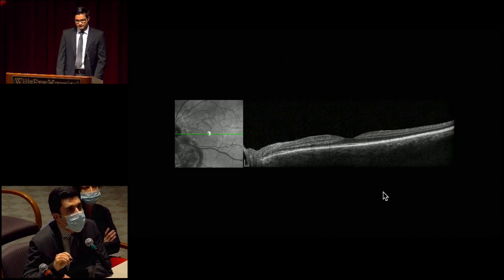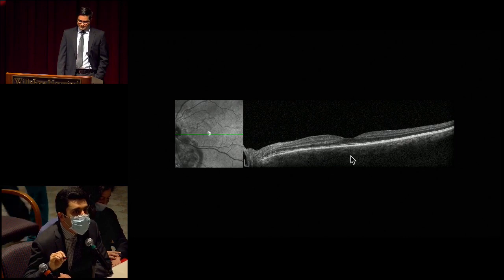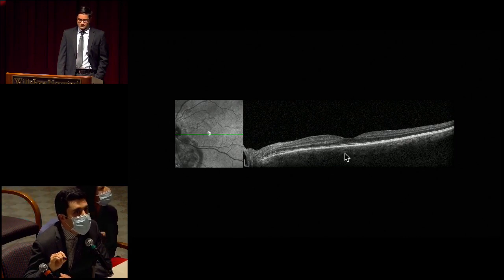We have the left eye. So similar imaging modality in the left eye, much more normal appearing. Again, the vitreous is optically clear. Here we appreciate the choroidal vasculature a lot more, though this is an EDI image. We don't really see the posterior aspect of the choroid a lot, so I would say this choroid does look thick to me comparing to the thickness of the retina.